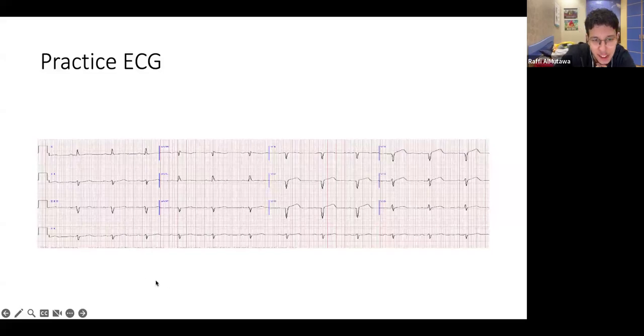Let's try this one. What do you guys think? All right, so this is okay. We're done with arrhythmias, by the way, as a whole. Now we're at ischemia.